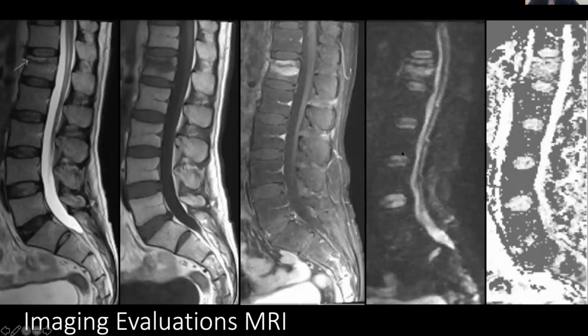And again, another example, differentiating benign from malignant vertebral compression fractures. In this case, on sagittal section, you can see the fracture, not really much of a diagnostic dilemma, but you can see the edema on the STIR, which is, as I said, a type of T2. You can see that the marrow is dark on the T1. And then we have these diffusion sequences, which in this case actually allow us to see that this is a benign fracture if we weren't sure.